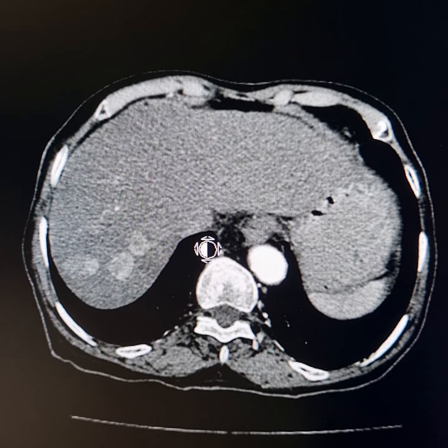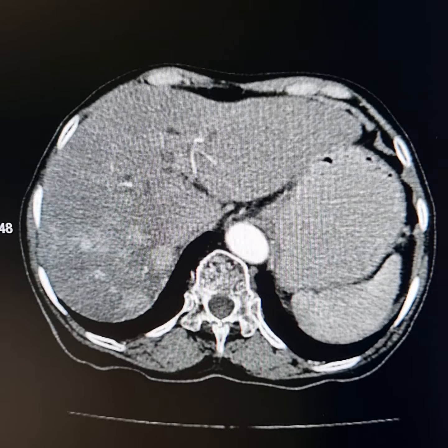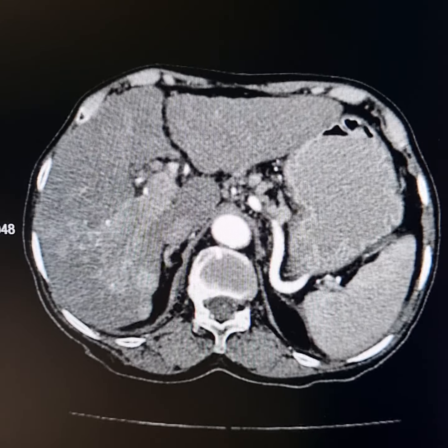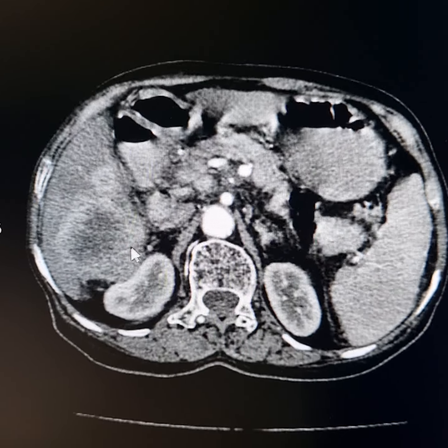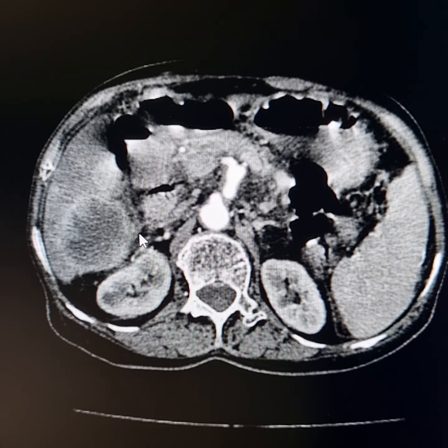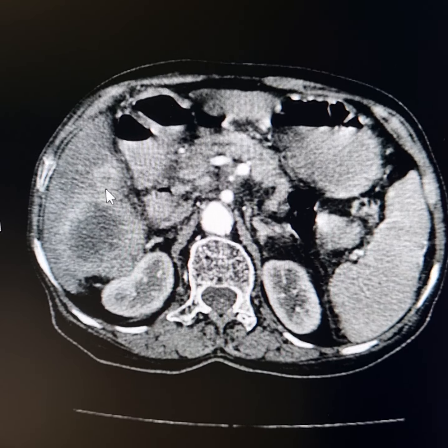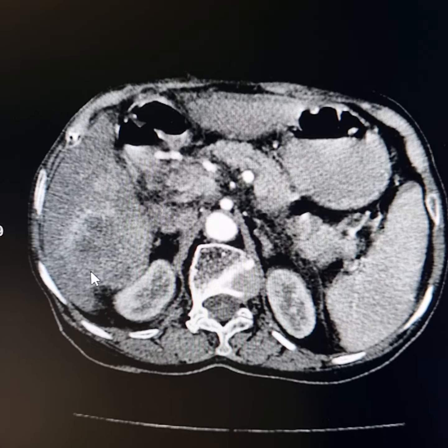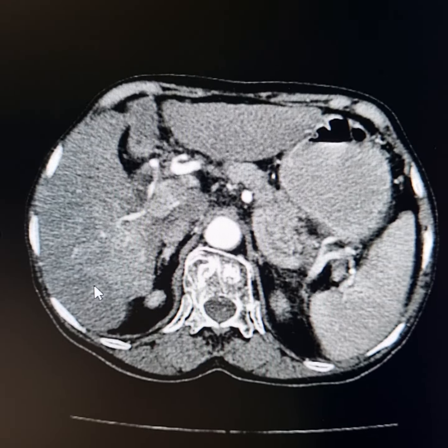Please observe these enhancing nodular lesions. These are the metastatic lesions in the right lobe of the liver. As I scroll down, this is the mass lesion here. It shows non-homogeneous enhancement. This basically is the hepatocellular carcinoma. The rest of the nodular lesions, like this one and the lesions that I have shown you earlier, are the intrahepatic metastasis.